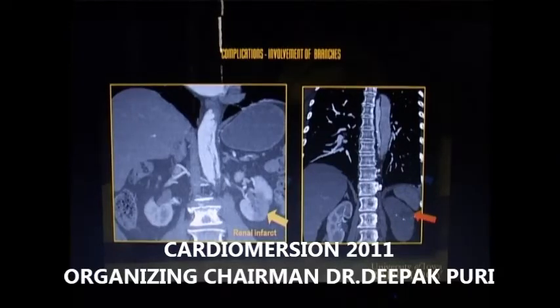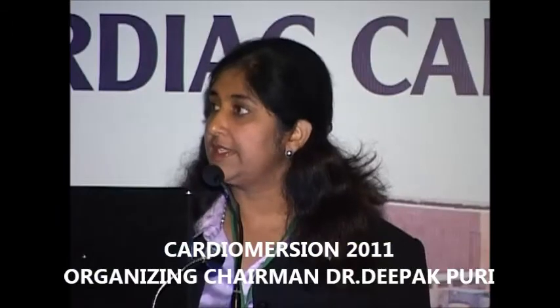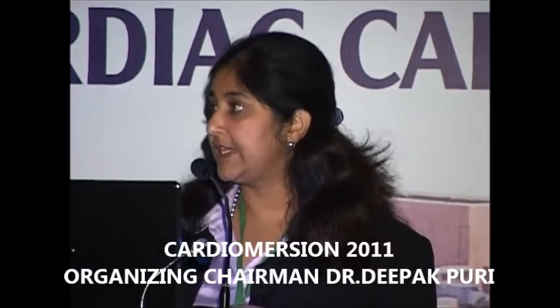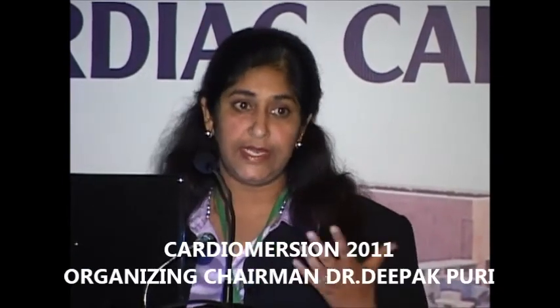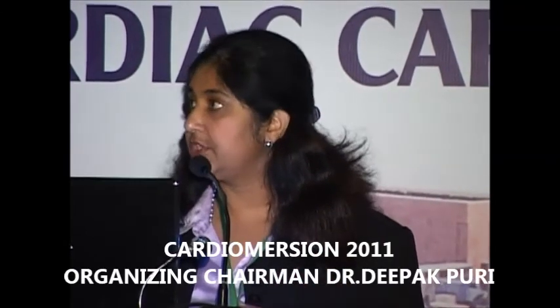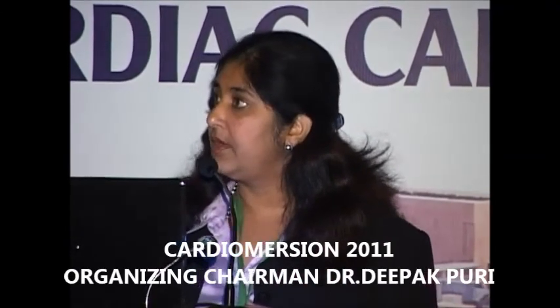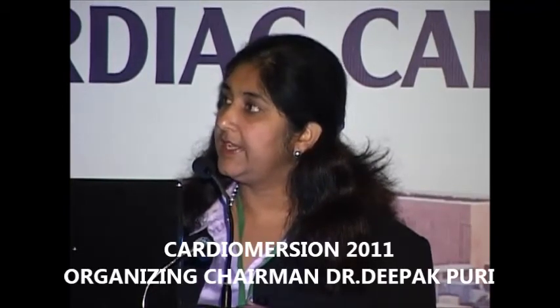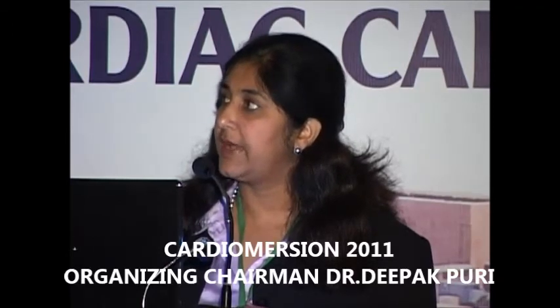The treatment of type A is mostly surgical, as you know, and the descending thoracic aorta can be managed with medical management. However, if the patient is having persistent or recurrent pain, expansion of the aorta or of the false lumen, or there is progression of the aortic dissection or end organ malperfusion, then in those situations intervention has to be performed. An example of a stent graft placement: this started off as an aortic dissection and then a contained rupture happened, and then an aortic stent graft was placed.